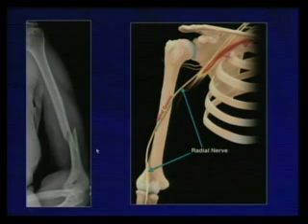In humeral fractures, the radial nerve may be entrapped in the spiral groove. This is a picture from radiographic, and you can see here the radial nerve that comes there, and at the level of the elbow, you will see two branches, the sensory branch and the motor branch, that is the posterior interosseous nerve. So in this case, we are looking for entrapment at this level.